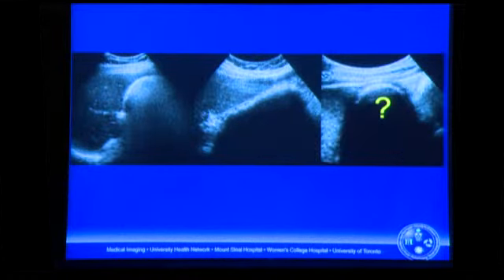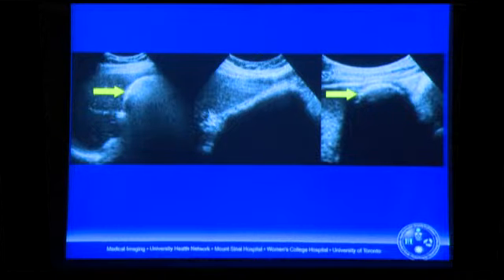And here's another interesting case. Challenge yourself on this one. I've lined them all up. We have emphysematous cholecystitis, and then we have the gallbladder filled with stones. So what's happening with the third gallbladder I've shown you? Well, if you look at that case, I would suggest that the wall in this case is indistinguishable from the wall in the emphysematous cholecystitis.